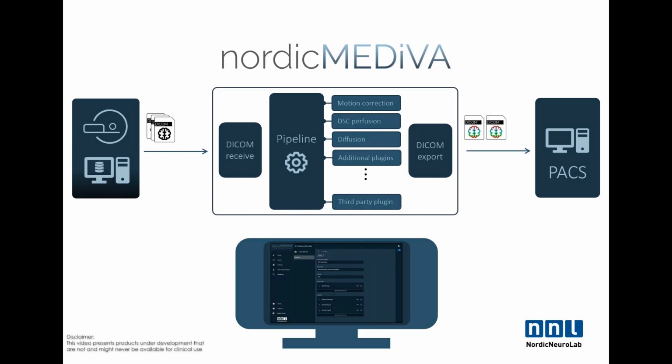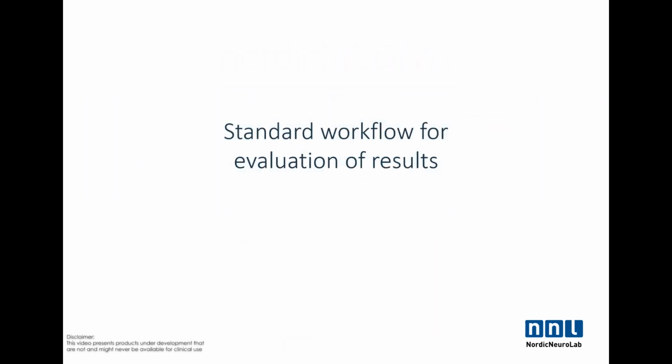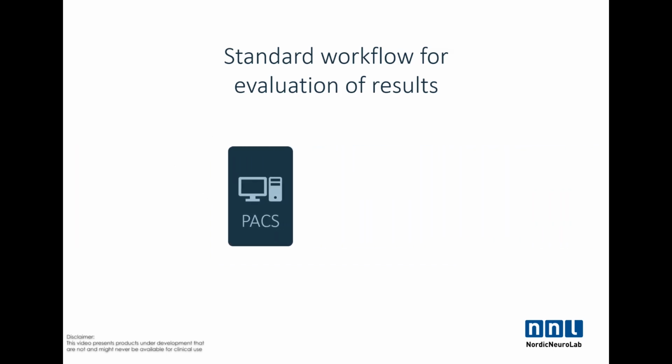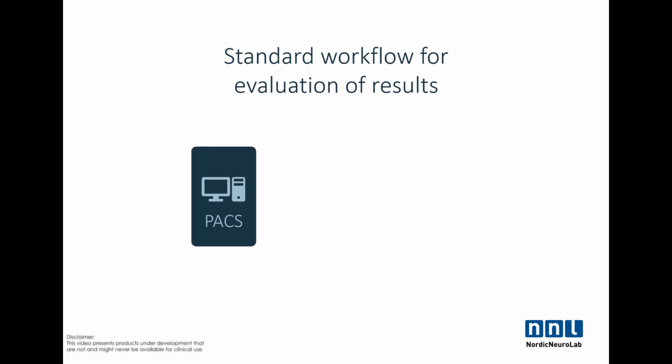I will now show you the different types of workflows in the system. In the standard workflow, data is sent from the MR scanner to PACS, and it will be automatically analyzed by the NordicMediva platform based on the specifications the user has defined. And the results will be sent to PACS. So this process typically takes a few minutes at max.